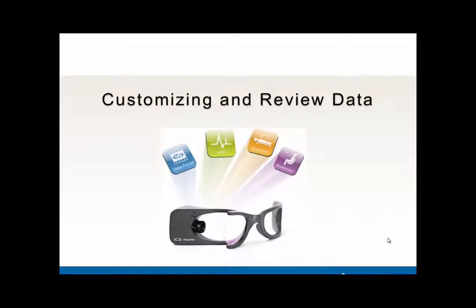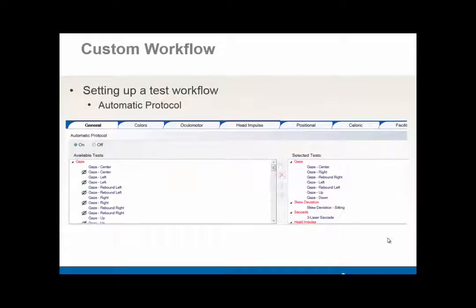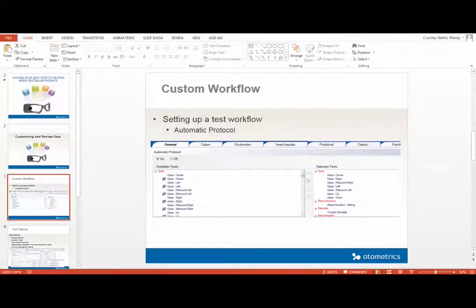Today we're going to talk about customizing your workflow and reviewing patient data. First, let's talk about customizing your workflow, how to set up an automatic protocol. Let's actually go to the software and show you how this is done.